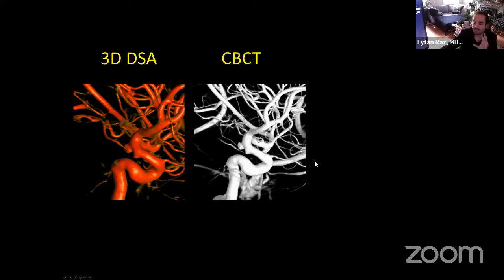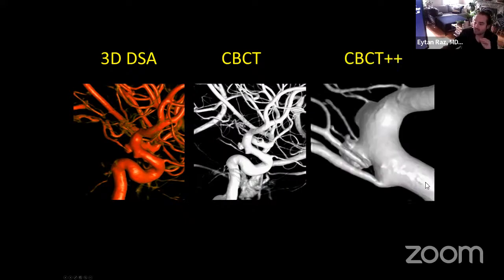And with the cone beam CT, when you look at the same vessel, now you understand a little more. You see that, for sure, this is an infundibulum. You understand a little better the shape of this aneurysm. You see more. Now, is there a way to maximize this even more? Yes, there is. It's about post-processing of the images that you acquired. And if you post-process with a smaller field of view, that's what you get.